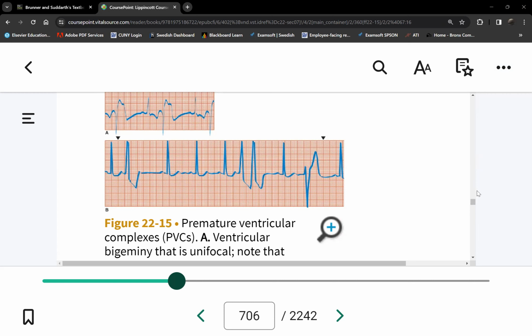So it's common to see, let's say, 10 beats of VTAC, 10 of these. How long would that approximately be? So if one PVC is about 1.5 big blocks, and I get 10 of them, how many seconds is that approximately? About 3 seconds, right? 3.5 seconds. So are patients even aware? Okay, so most patients will not experience any symptoms, right?